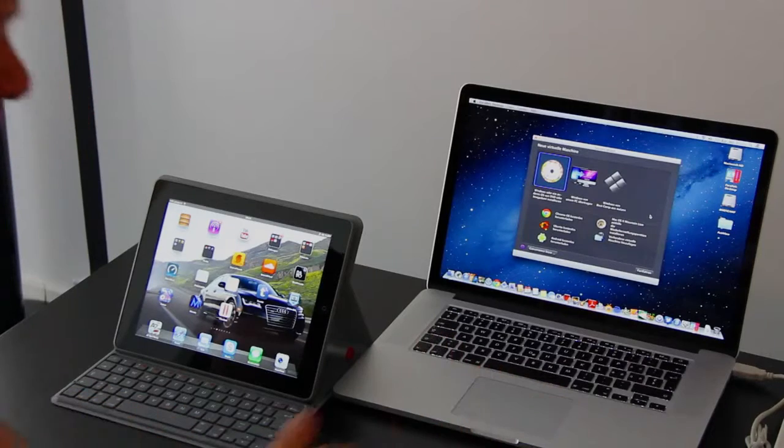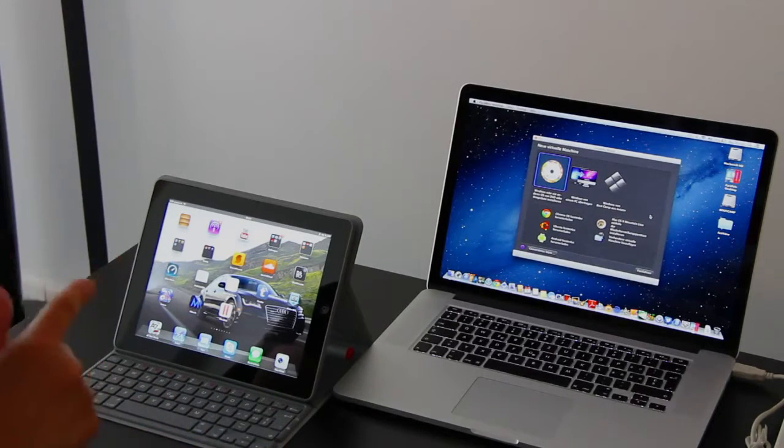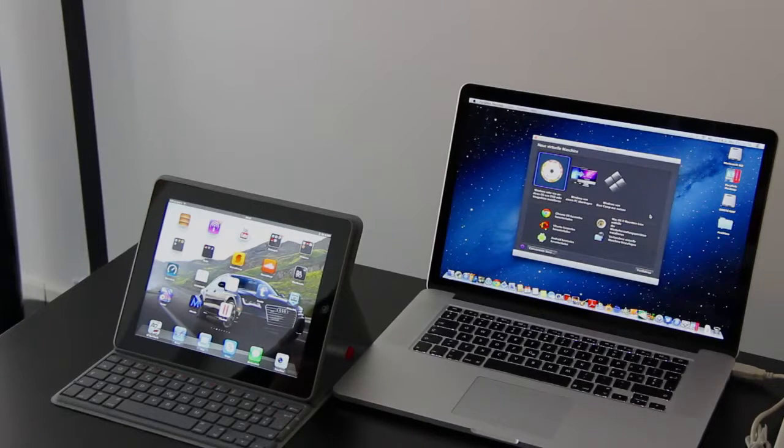As soon as Parallels launches, it asks to install virtual machines. We don't need to do that. All we need to do is start the actual app, because that app will connect any iPad or iPhone on the same network to the actual MacBook Pro or iMac for the lab.